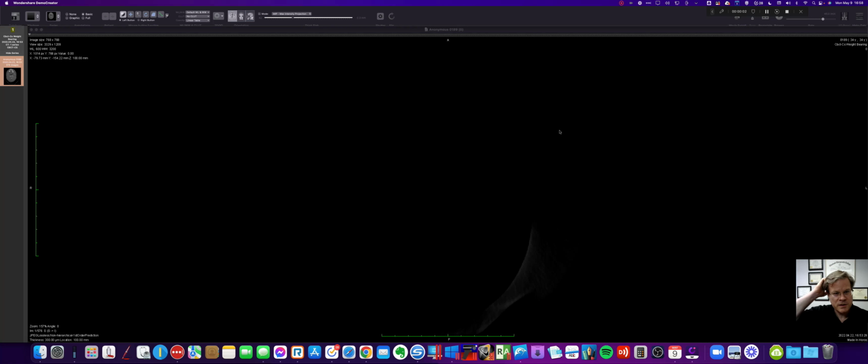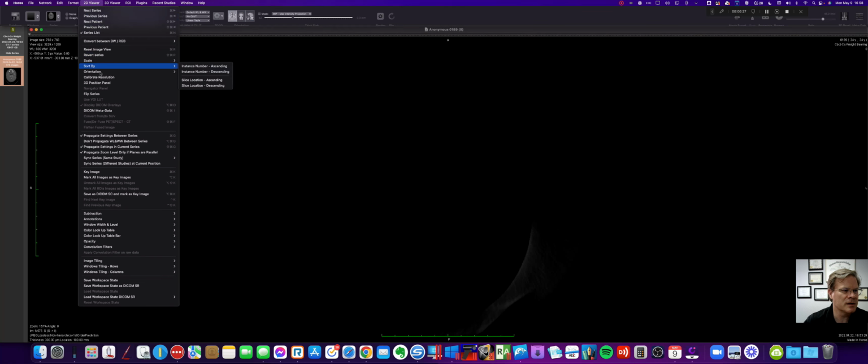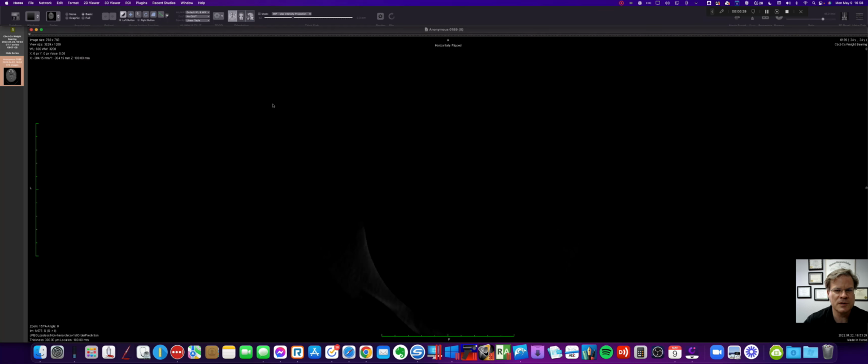Okay, we are going to analyze a cone beam CT scan of the cervical spine based on the Blair upper cervical chiropractic protocol. The first thing we're going to do is come up here and find the 2D viewer and go to orientation and flip horizontal.